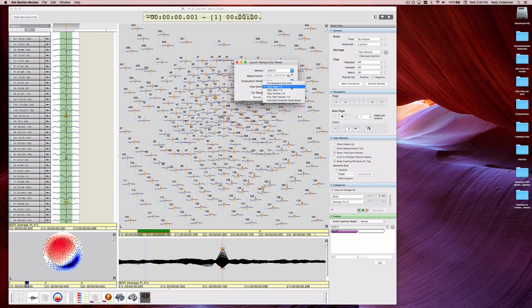Only the Atlas head models that correspond to the appropriate channel count that fits the EEG you have loaded in Review will be shown. For example, the file loaded in Review right now has 256 channels. Therefore, the Atlas models for 0 to 2 years and 2 to 9 years that have 128 channels will not be shown. There is an example individual head model that is provided as a demonstration of how the RVE would visualize an individual head model.